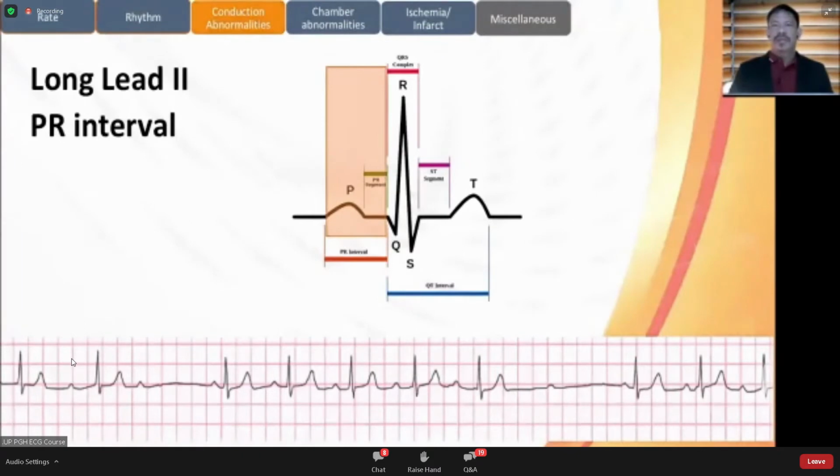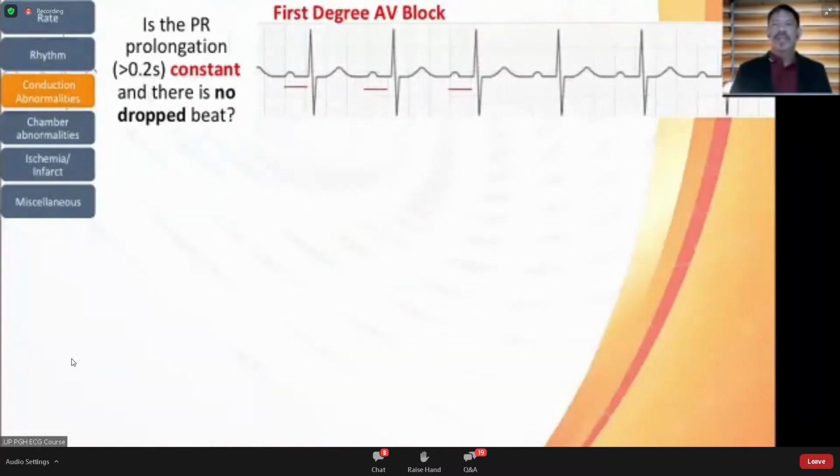In relation to irregular rhythm, a group of abnormality can present with dropped beats due to problems of atrioventricular conduction. We had appreciated the value of checking P and QRS morphology on previous ECGs. Now we'll focus on PR interval. AV block occurs when impulse conduction from the atria to ventricle is impaired. The strips show obvious pause after a P wave, which is what is referred to as drop beat. To check for AV conduction abnormalities, we measure PR interval.